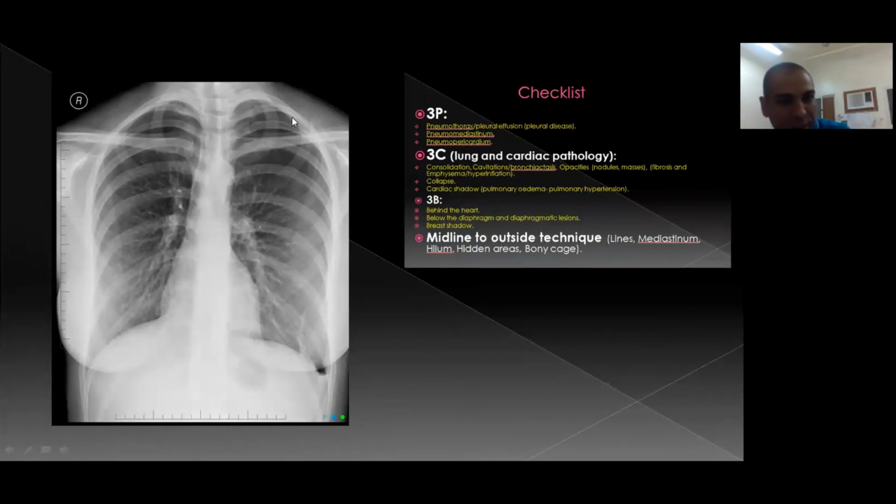And this is jet black. This is a pneumothorax. It doesn't look like this one. Look for these bronchovascular markings reaching the periphery, while this one is jet black. Sometimes there is surgical emphysema in the chest wall. Maybe this one helps you to concentrate more on whether there is a pneumothorax or not.